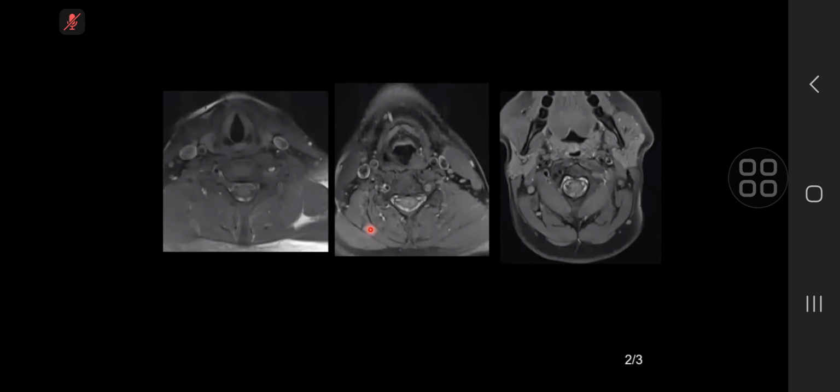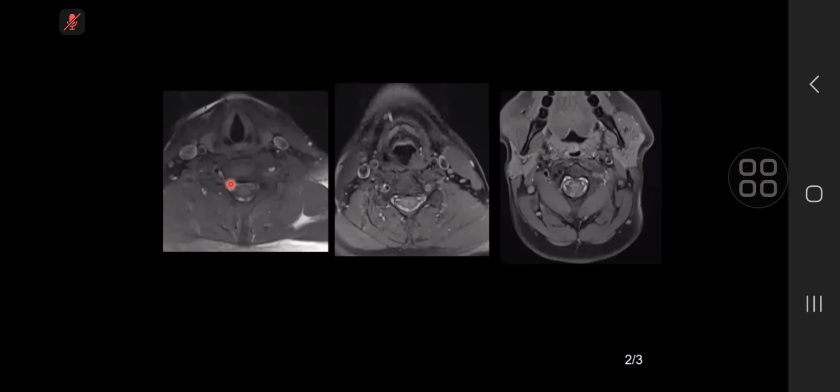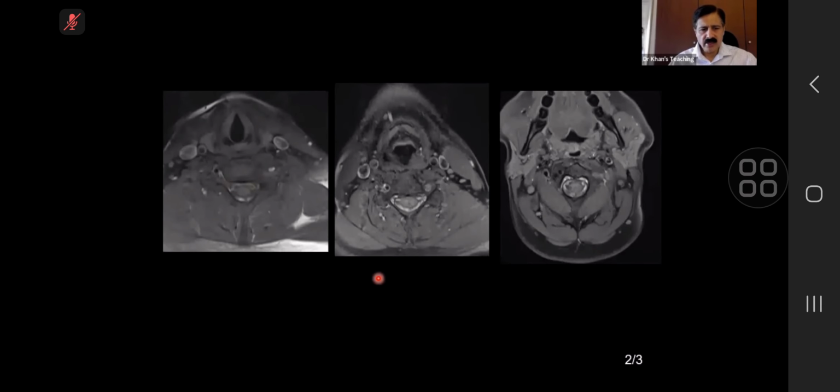So I think the patient was young and the patient had stroke. And now looking at these MRAs, I can see there's a filling defect in the right ICA. Patient must have had trauma leading to the acute stroke into the occipital posterior circulation. Is this the ICA? No, sorry, vertebral. Sorry, right vertebral. So you mean to say this right vertebral is abnormal, correct? Yeah. This is what you meant. Yeah. Okay, I will take over.